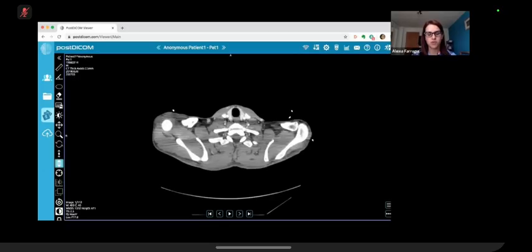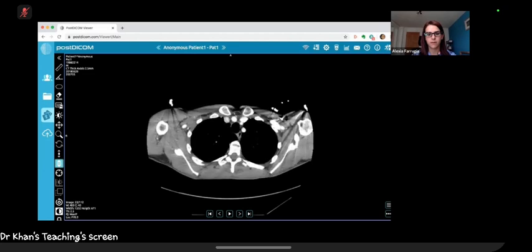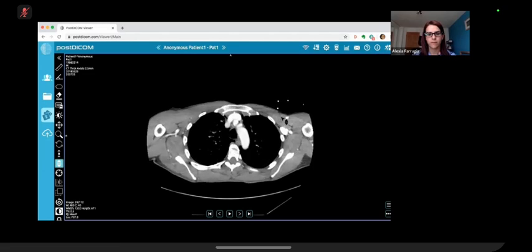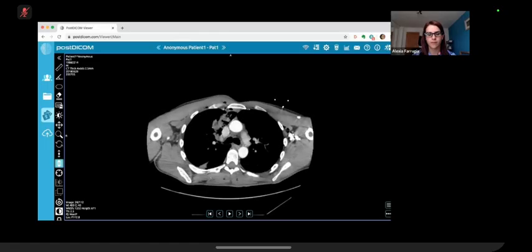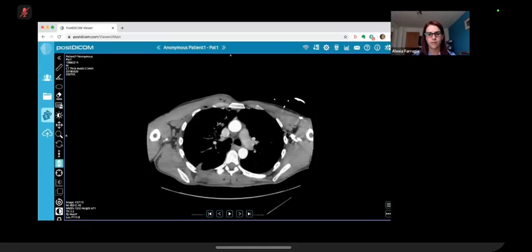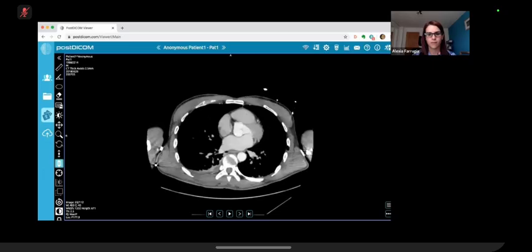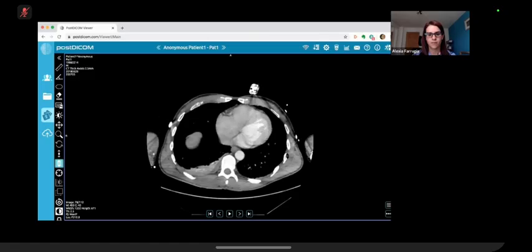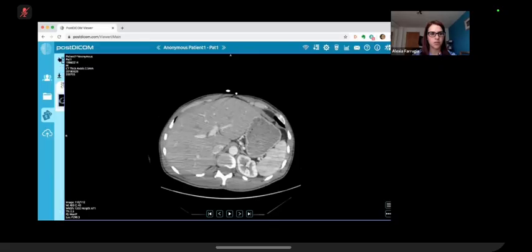And I will show you 2 windows. I'll show you the soft tissue window, and then I'll show you also the lung window. Okay? So just have a look. Okay? I'll switch the window for you.